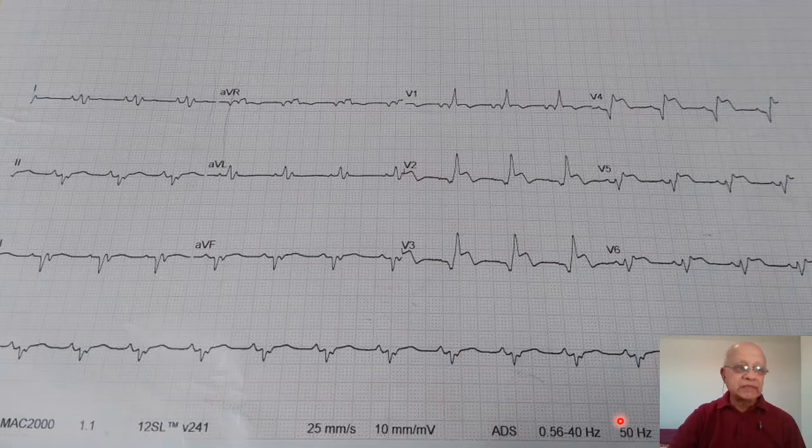Now this ECG, which was sent to me by Dr. Priya of the nephrology department in the Baby Memorial Hospital, Calicut, is the ECG of a 68-year-old male who came with chest pain and sweating to the emergency and was admitted to the cardiac ICU. Now my questions are, first, what are the changes which you notice in this 12-lead ECG?